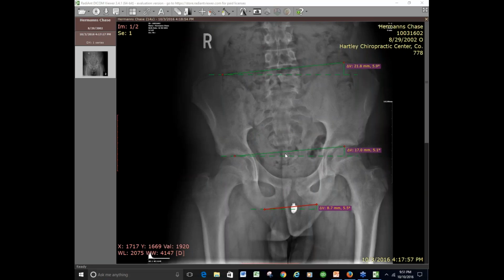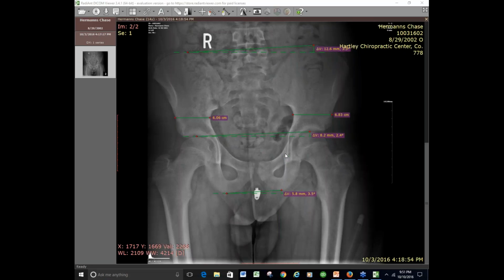Just two questions then. One, I notice on the femurs, and it looks around the ilium as well, the outline of the peripheral part of the bone is so white. Is that a normal finding? Of the peripheral, you mean way out here? Like on the femurs. Do you usually see it that white, or what is that?